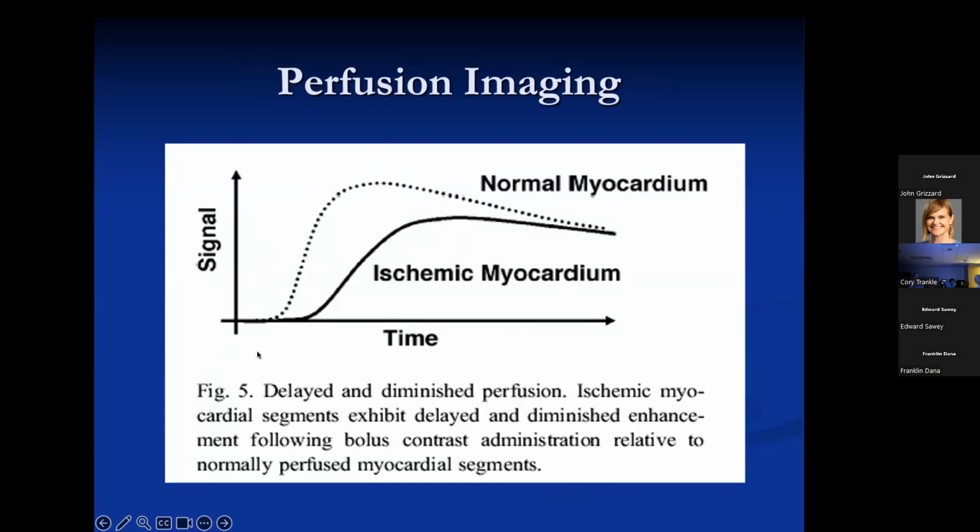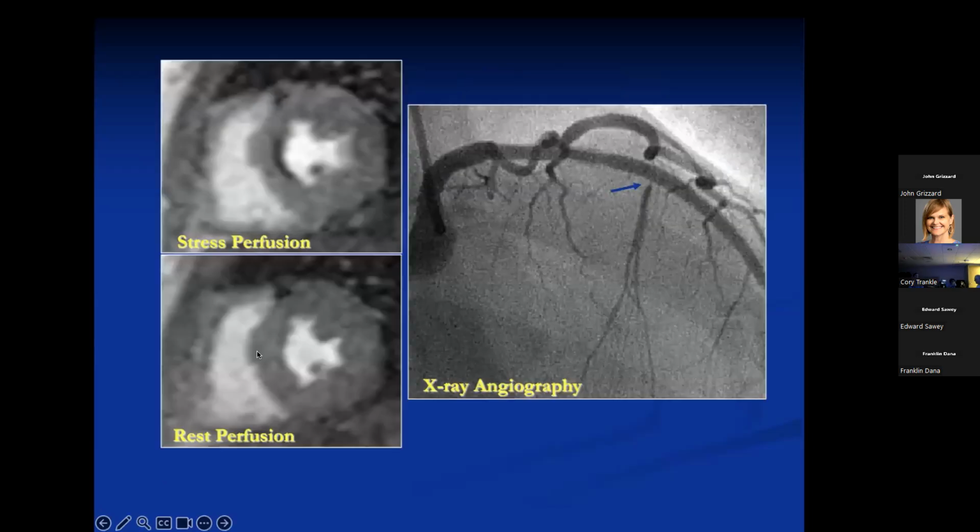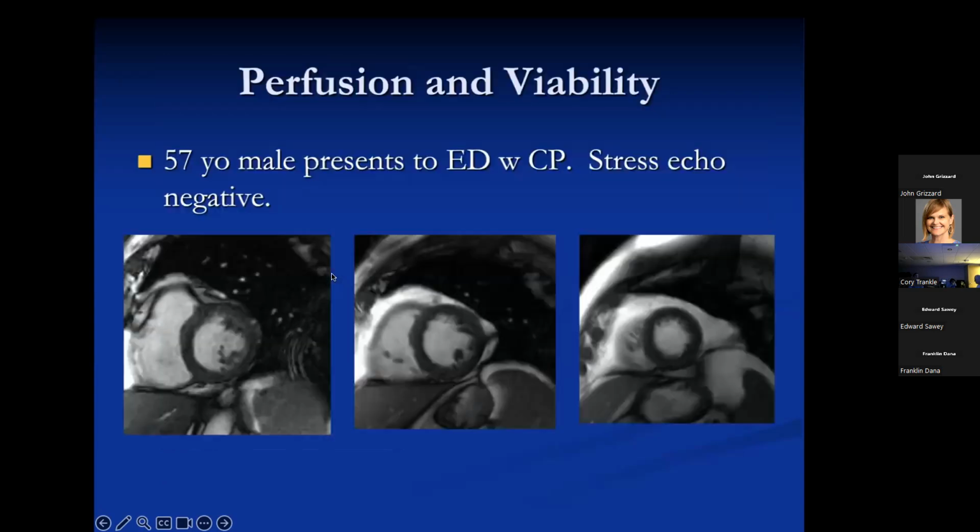These are signal intensity curves. So here's a still frame from a case where you have a septal perforator that's highly stenotic, and you see a very nicely depicted defect there. That would be tough actually to distinguish from a dark rim artifact, except those are usually larger.